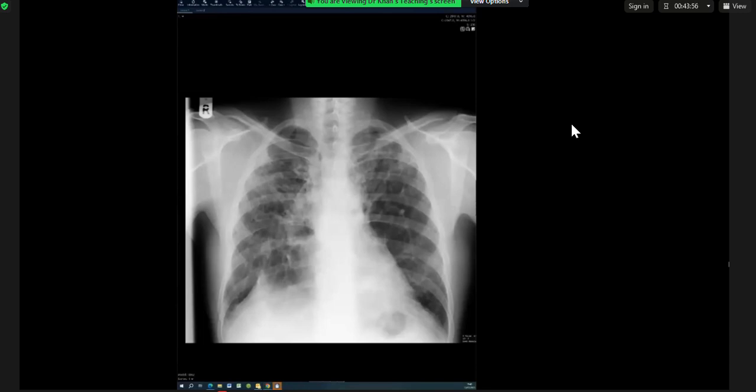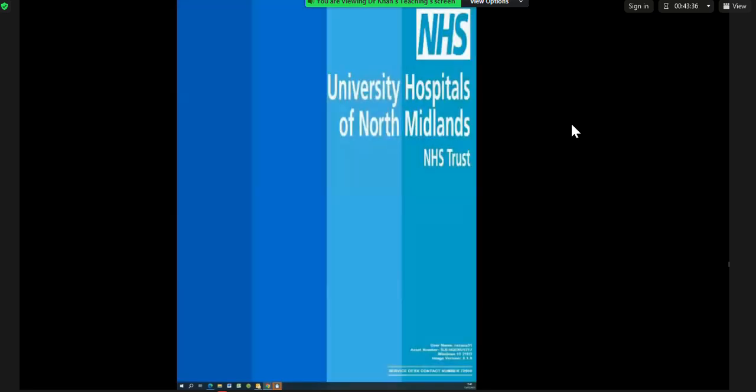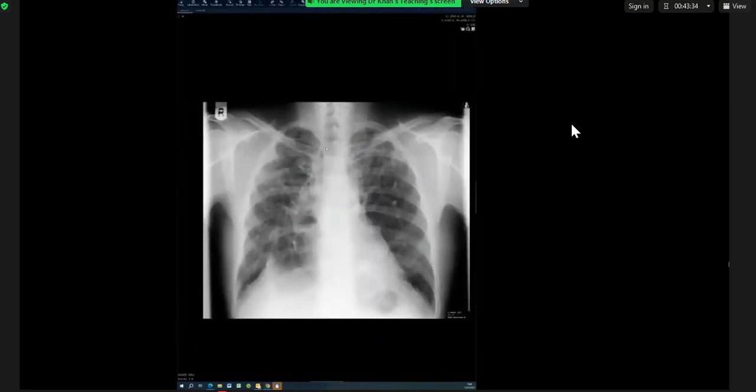Tuberculosis. I'm looking for any apical opacities. Then another cause is radiation, but there is no specific pattern of involvement for radiation. Another cause could be ankylosing spondylitis, so I'm looking for any calcification of the interspinous ligaments, which I would like to window for appropriate viewing. And another cause could be drugs, so I will inquire with the patient for any history of drug exposure. Okay, well done. That was so much better than the first time.